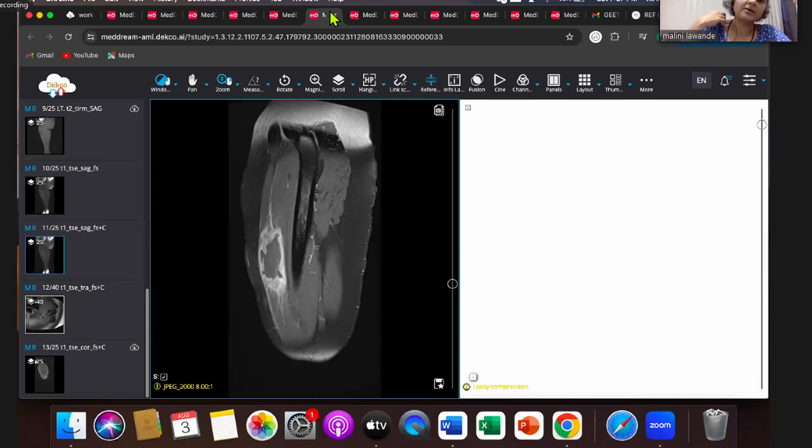This turned out to be a staph aureus, which was grown from this. So it's important: the reason for the T1 hyperintense rim is that peripherally in infection, you can have a granulation tissue-like appearance at the periphery, and that causes the T1 hyperintense rim. That helps you distinguish a tumor from an abscess quite confidently, and giving contrast also shows it well.